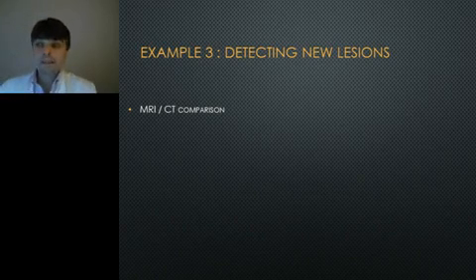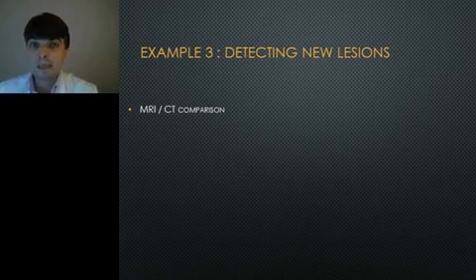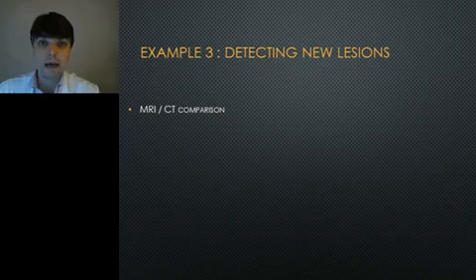Okay, we saw how it's maybe easier to see lesions. Now, can we detect more lesions? Based on our experience and reviewing the comparison between CT and MRI, we do not detect more lesions in a large cohort of patients that we saw looking for HCC. But definitely, it's easier to see, and we have some examples where definitely the lesions were seen at spectral CT and were very difficult to detect, even at liver MRI. And I will illustrate that with one example in the next slide.